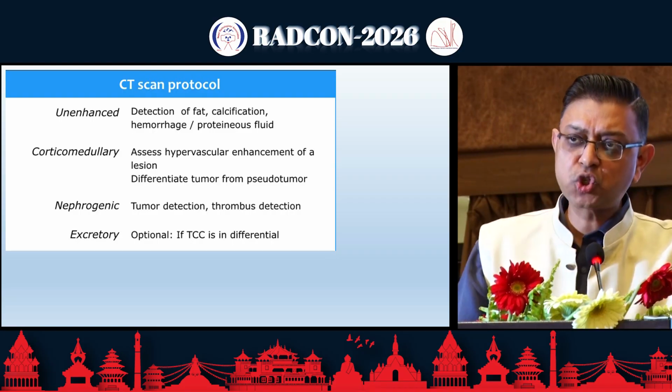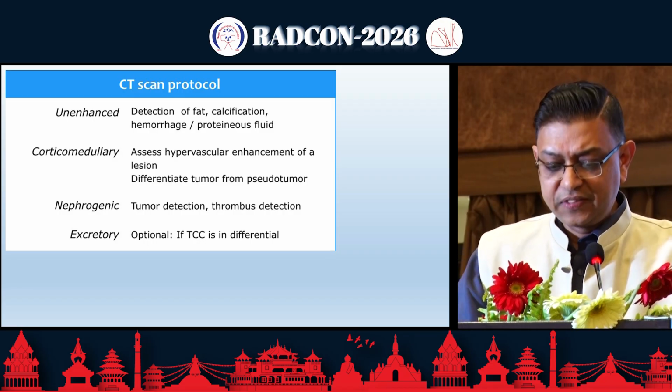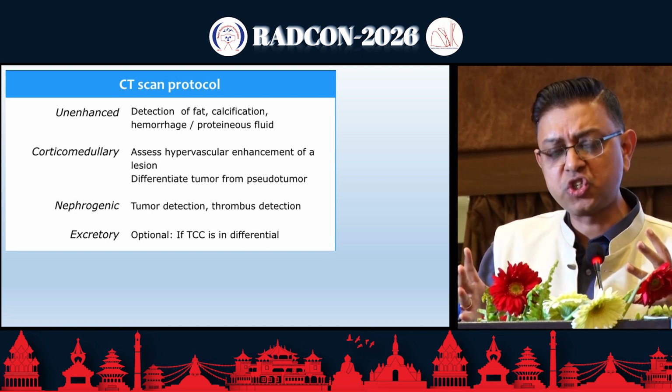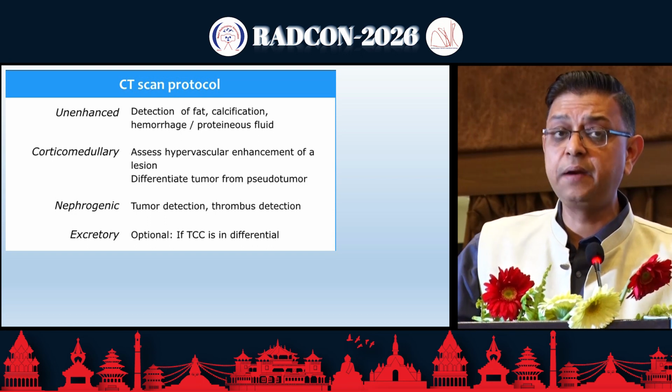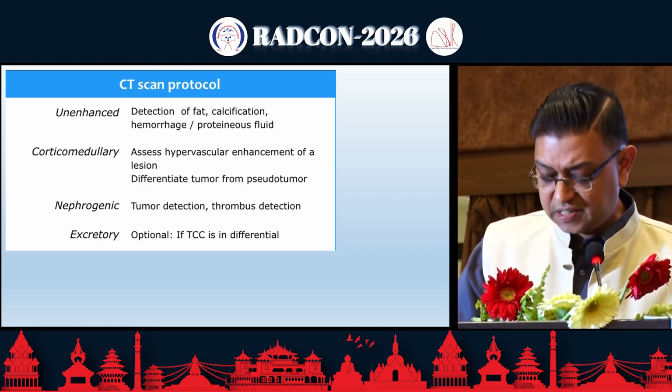Starting with the first and most common type, that is the clear cell carcinoma. This is the most common type. This tumor arises from the renal cortex. It is often expansive, heterogeneous. It shows very good contrast enhancement. It may contain both calcification and fat. This may be bilaterally symmetrical.